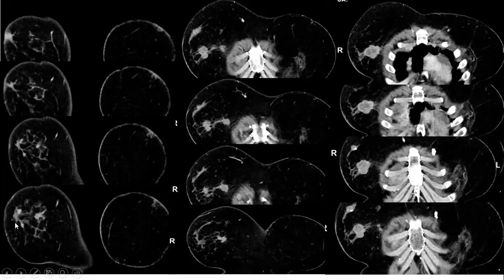You see, these lesions interconnecting, giving you the added density, okay? And this is the nipple in the contralateral breast, but the whole area is fatty. I could not appreciate. And again here, these are the lesions interconnecting. Look how the band-like density seen on mammography. Look, this is the tumor band extending between all, even the upper outer lesion. Look for the tumor band extending from that and from this.